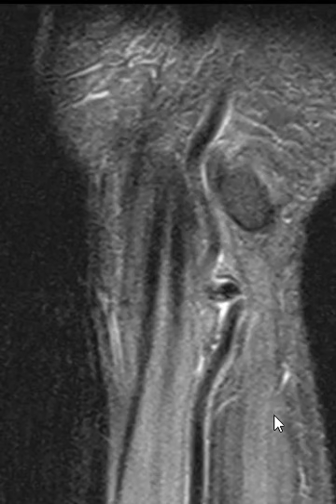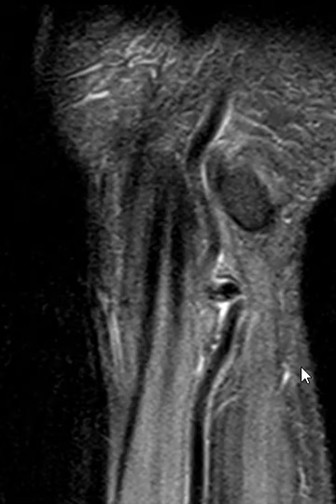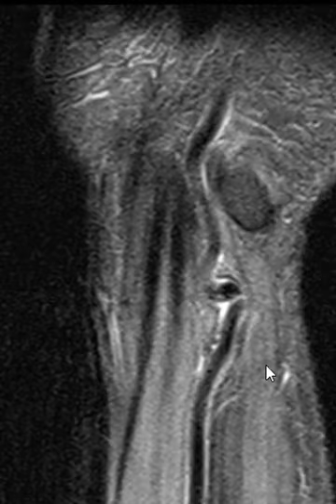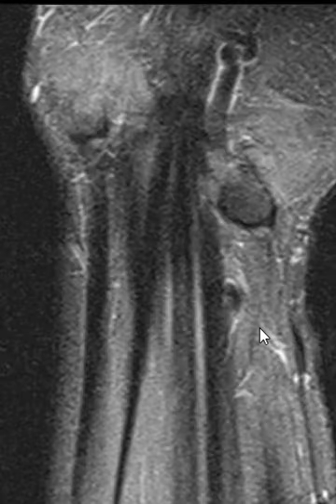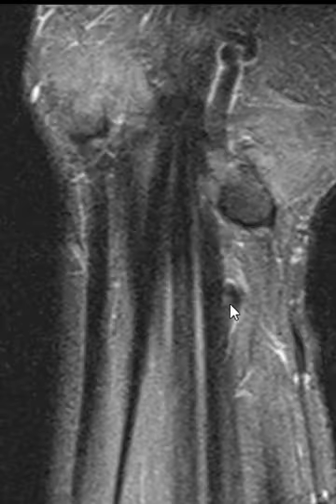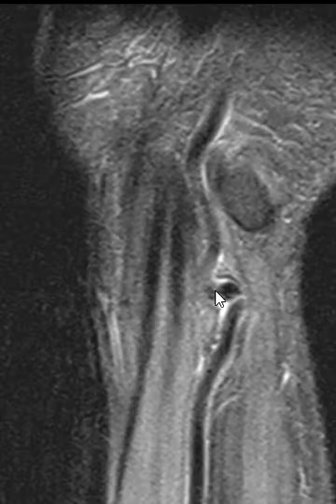The latest one he was referred to was a neurologist, and the neurologist had done a nerve conduction study and said that he did have an ulnar neuropathy. So the question was, why does he have the ulnar neuropathy? He came to us for an MRI, and on the MRI we see this dilated vessel over here. This is the palmar ulnar aspect, and this is the ulnar artery. And the ulnar artery is elongated and tortuous, makes a funny loop here, proximal to Guyon's canal.